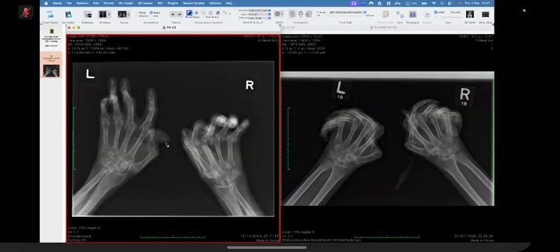It looks like the same diagnosis, but this one has also a distal interphalangeal joint affection. This is maybe erosive arthritis. But actually, rheumatoid arthritis also, because the proximal joints are also severely affected.